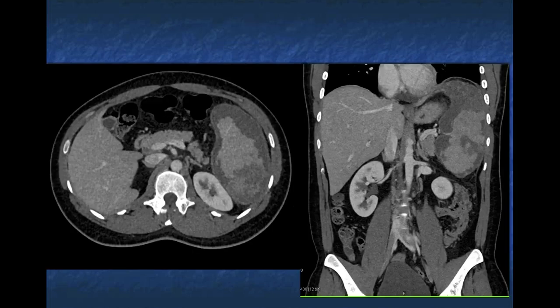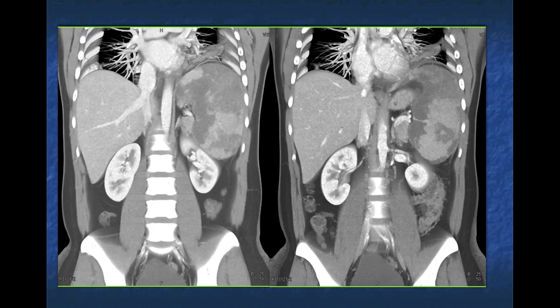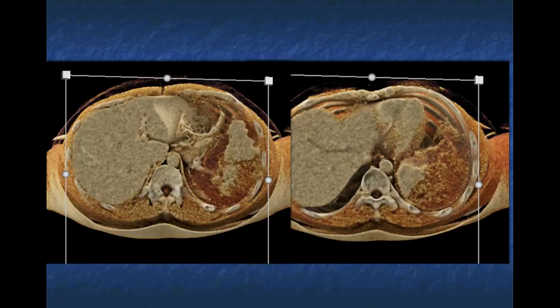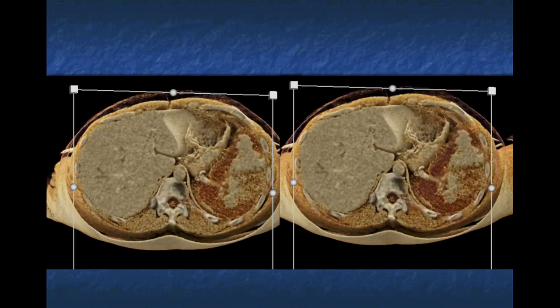Now look at the spleen. The low density areas have increased. The normal splenic tissue is markedly irregular. I'm showing you a few different images really nicely, even with the cinematic rendering. Remember, red tends to be fluid. You see the defects, which in part you could think of as infarcts, but the way it's around the host splenic tissue, the way it's in the periphery, I'll show it to you there on the cinematic rendered axials.